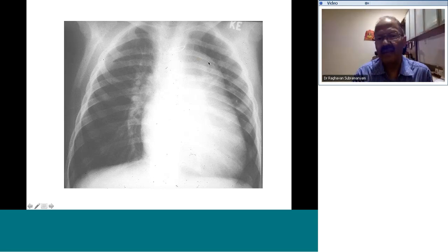In congenital heart disease, before you diagnose anything wrong with this contour, please make sure that it's a well-centered X-ray and the clavicles are equidistant from the midline. Because if a patient is turned towards the left, almost like a left anterior oblique, you would get a bulge in the left upper cardiac border like this. And the normal pulmonary artery could also look a little bulged.